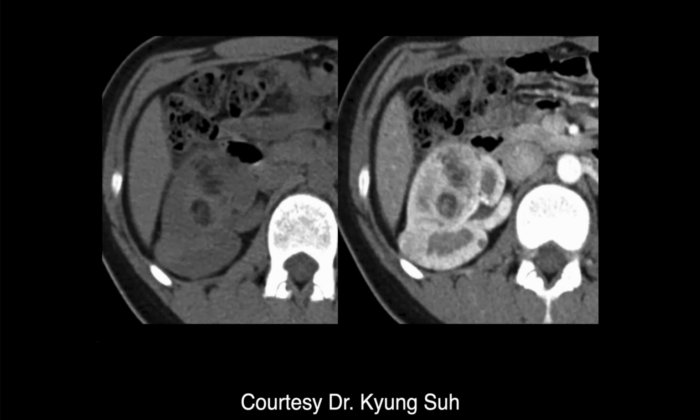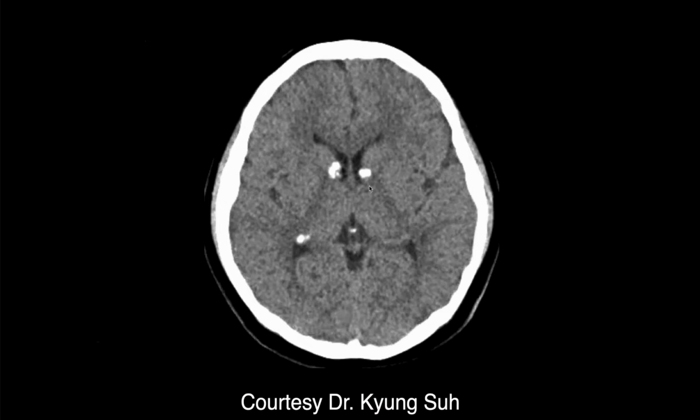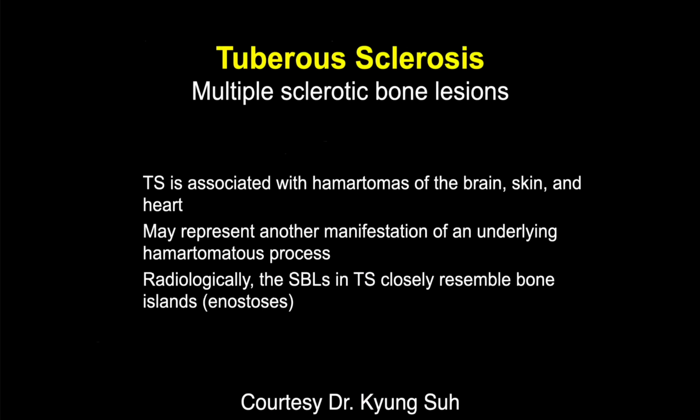The kidney looks like there may be a mass centrally there. So what you have are sclerotic areas in the bones, a kidney mass, and then calcifications in the basal ganglia in the brain. And this is tuberous sclerosis.